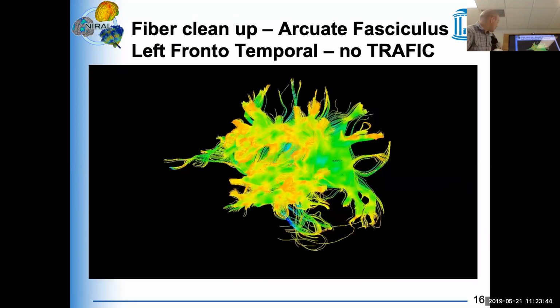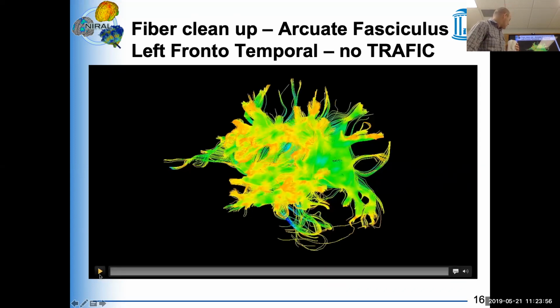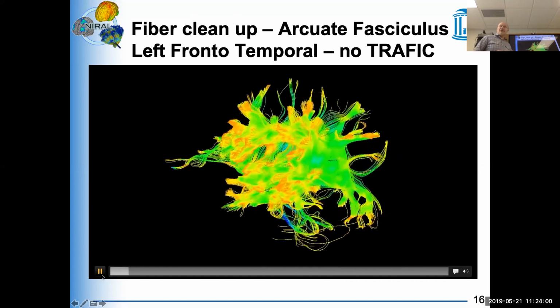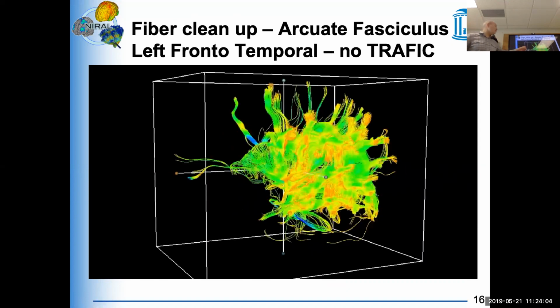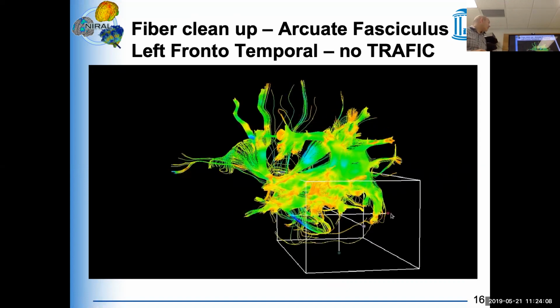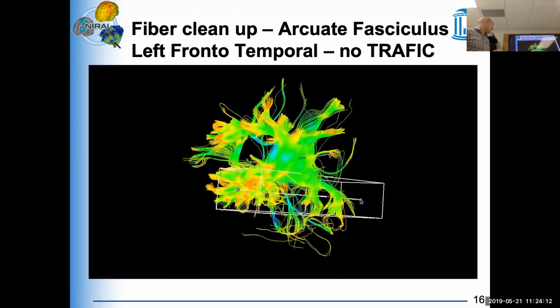This, rather than a demo, there's another view. I'm not sure what happened here. And I'm going to run this. Now, this is not how it would look after the fiber cleaning. This is how it would look before you would run the fiber classification.